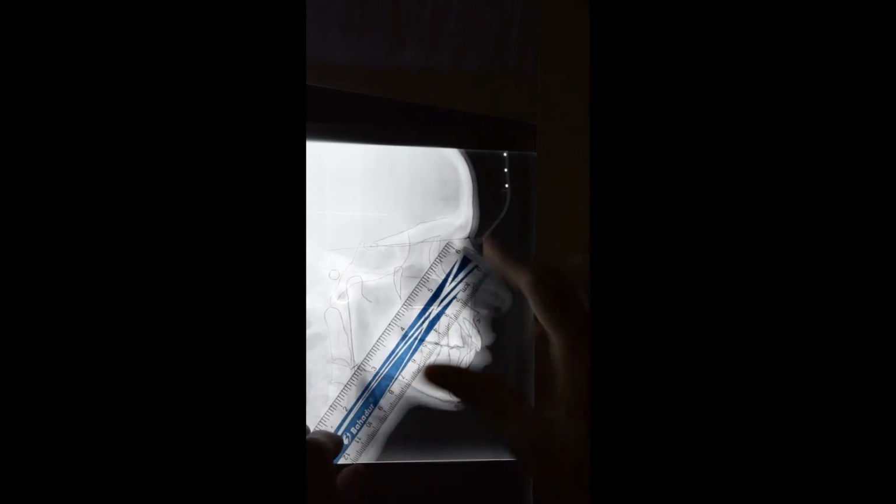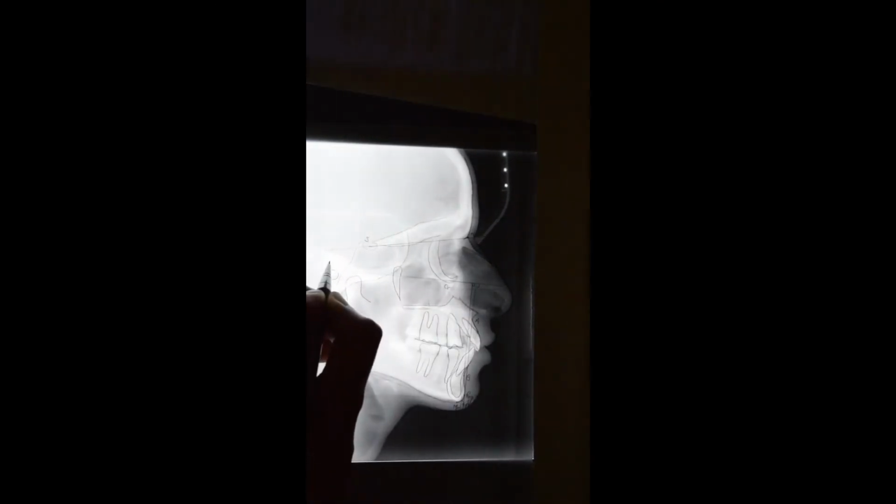There we go. And this becomes point gnathion.